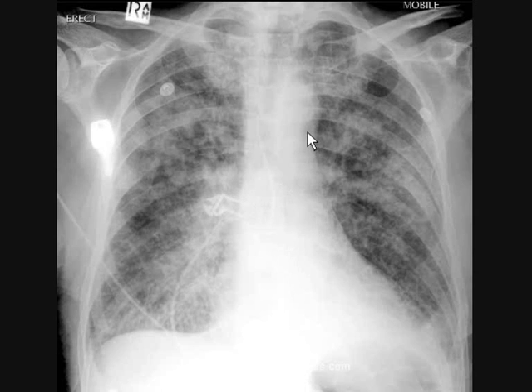Bilateral haziness is because of the presence of fluid in air spaces which should normally contain air. Although there are a few differential diagnoses, the appearance in this case is because of acute pulmonary edema. Pulmonary edema can be a result of acute changes, and it is known as acute pulmonary edema in that case, or can be a result of a chronic process.